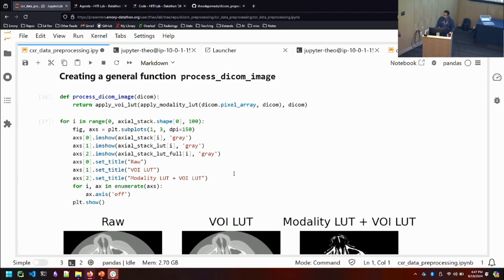So when we look at the raw data of the image, and if the range is from 0 to 65,000, we cannot perceive that. And maybe if you had a super deep model, it could distinguish between those. But what do we want to do? We want to bring all of those intensities into a range that is sort of human readable, or more clinically relevant, or anatomically relevant, right?